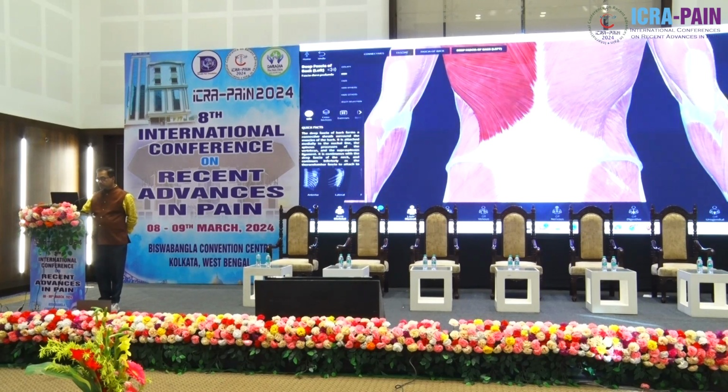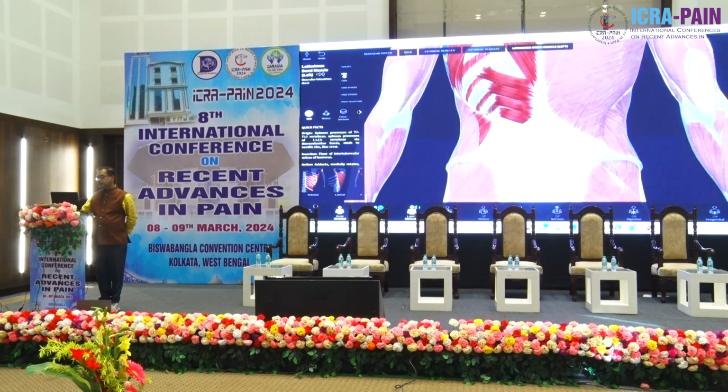So in the lumbar area, if you are close to midline, we will not be able to see the latissimus dorsi muscle. But if you are going a little laterally, particularly the upper and the lateral part, we will be getting the latissimus dorsi muscles. Here the latissimus dorsi is very thin, like strap muscles. If you are going up, then the latissimus dorsi muscle is becoming thicker. So now I am removing the latissimus dorsi muscle. Let me remove it. So now this is your thoracolumbar fascia.